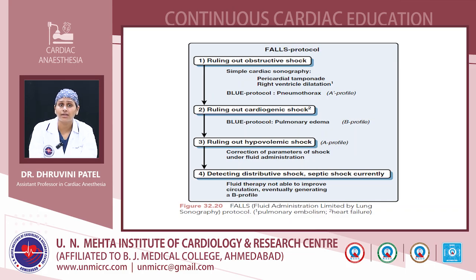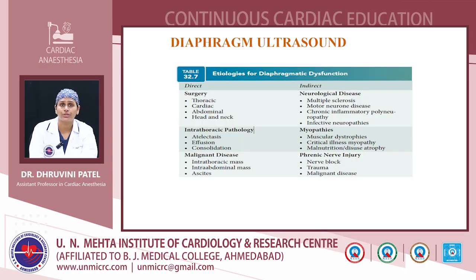This diagram shows fluid administration limited by lung sonography, the FALLS protocol, to rule out obstructive shock, cardiogenic shock, hypovolemic shock and distributive shock with the BLUE protocol. Diaphragm ultrasound.